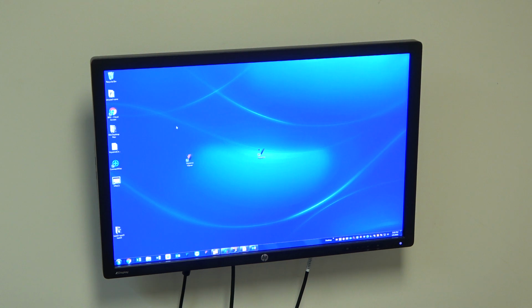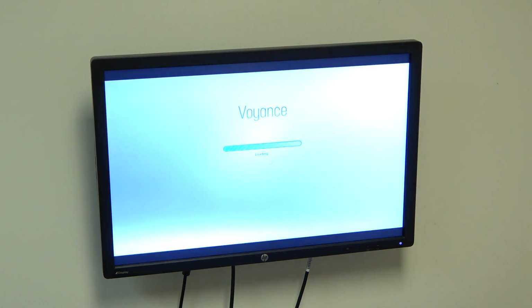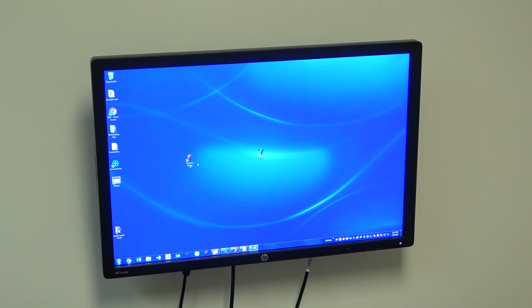It'll put this icon on the desktop, and the very first time you double click on this icon, before it automatically logs in, it would pop up asking you for the license. You would put in the acquisition computer static IP and just hit the connect button, and it'll connect. And then you would go into the engineering and configure users for that particular viewer, because they are all individual. The ones that are set up now in our acquisition would not transfer over to the viewer software. So that's the way that we install viewers.